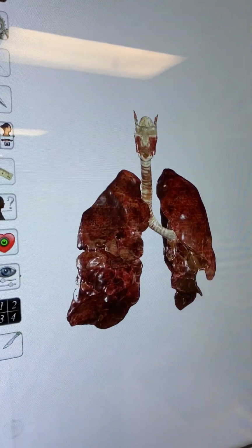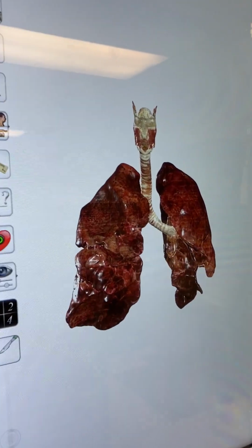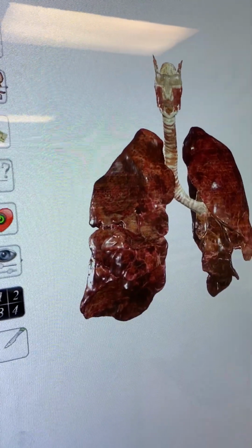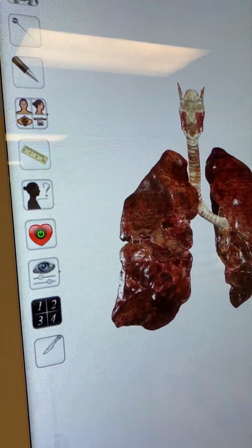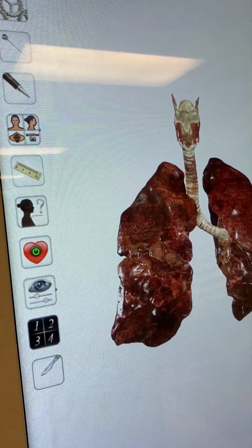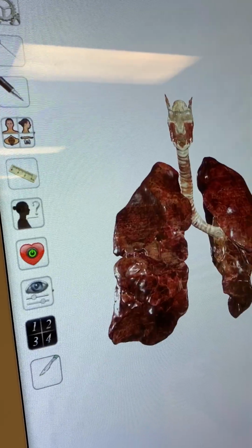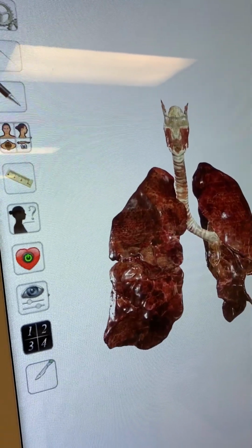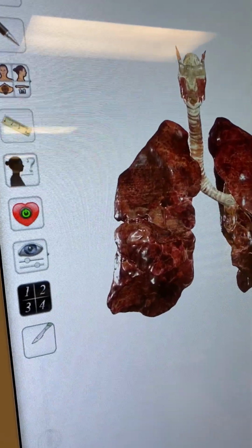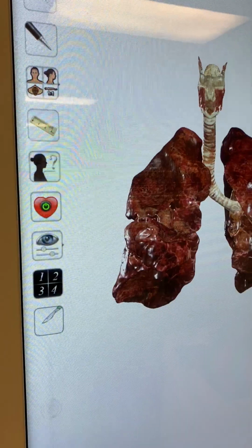How to adjust table application properties. This is the second video. In this video, I'm going to talk about how to use default on, how to use structure pronunciation, how to use feature lock, how to use spin, how to enable the table ruler, and how to change the language of the table. Let's look at the first one, how to use default on.